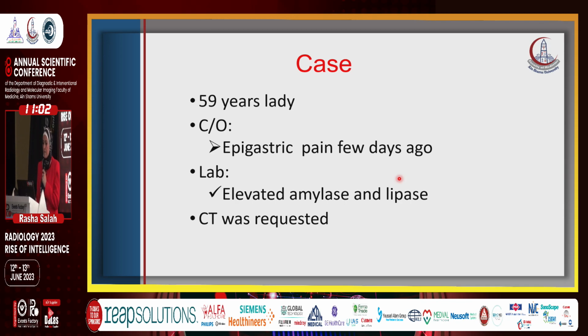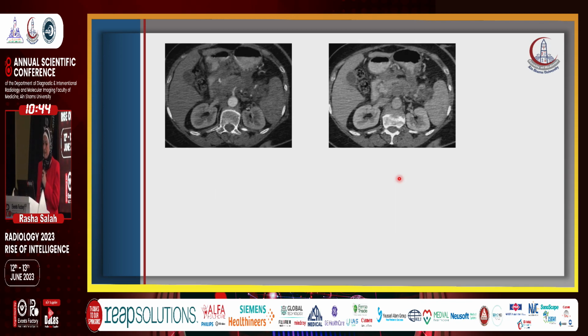This patient is 59 years old and presented with pain for a few days at the epigastrium. Her labs demonstrated elevated amylase and lipase. Of course, this is a clinical scenario to suspect a case of pancreatitis. The patient was referred for CT. This was her CT triphasic study.